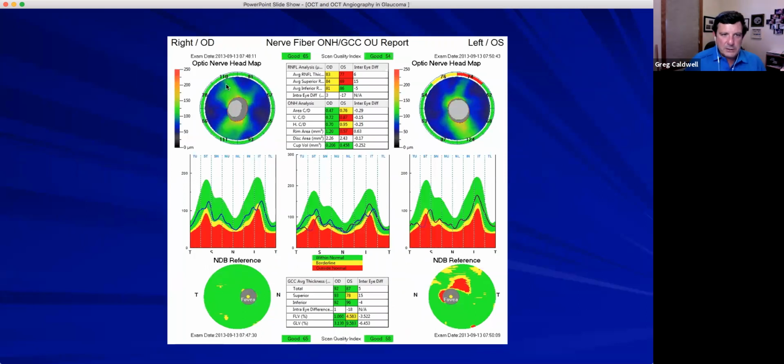And again, going to your patients, let's just say this patient has a high IOP. Here's 110, here's 111, just jumping over here corresponding. Why is this 110 and this is 74? Here it's 124, here it is 111. So you might argue that this might be the one that's healthy. There could be a little bit of loss inferior, but there's certainly loss superior temporal here.